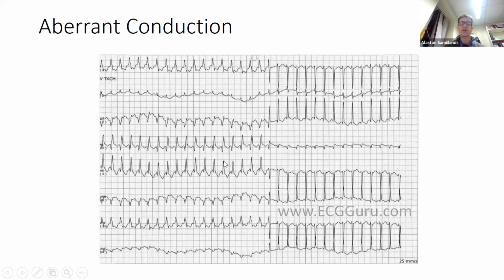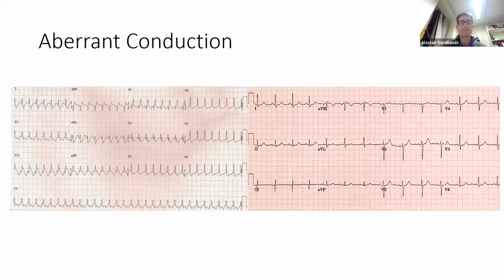It can be either. We see right bundle branch block tachycardia where the heart is fast going into narrow complex tachycardia, or it could be the other way, narrow going into broad. But when we look in V1 or V2, we see the typical bunny rabbit's ears and the broad QRS to signify right bundle branch block. So that's why I keep showing you right and left bundle branch block, so you're used to the pattern of what that looks like.